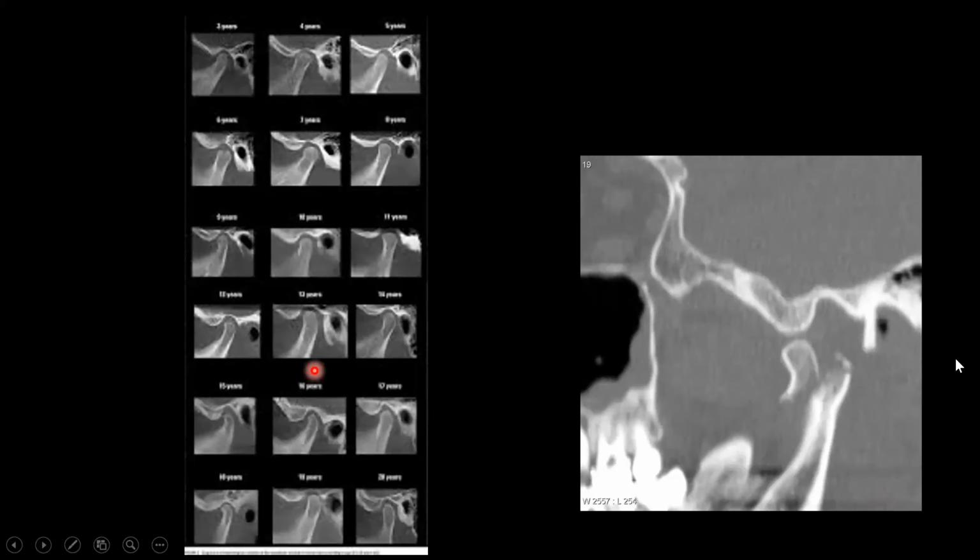These are multiple slices of the opposite side of this patient. You can see the temporomandibular joint. This is temporal bone and this is the mandible. So temporomandibular joint. On the opposite side of this patient, he is not only having fracture, but also dislocation from the joint. So this is temporomandibular joint dislocated fracture. So fracture dislocation of the mandible, mandibular condyle. Fracture dislocation of the mandibular condyle. This is very important.